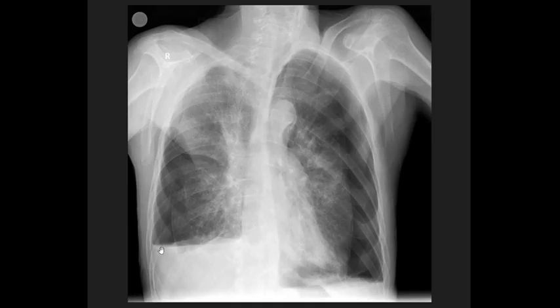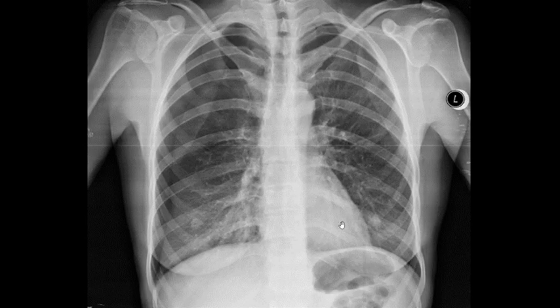But we see that here is also a horizontal line, and that here we have a soft tissue shadow with a horizontal line. On the other side also, this is actually a pleural effusion, or you can call it also a hydrothorax. So there is fluid in the pleural space, and there is also air in the pleural space. So this is hydropneumothorax. A combination of fluid and air in the pleural space is called hydropneumothorax. So it is, in this case, bilateral, or it is present in both hemithoraces. So these are three interesting Röntgen's X-rays that show a simple, easy identifiable pneumothorax, then also some complicated cases.